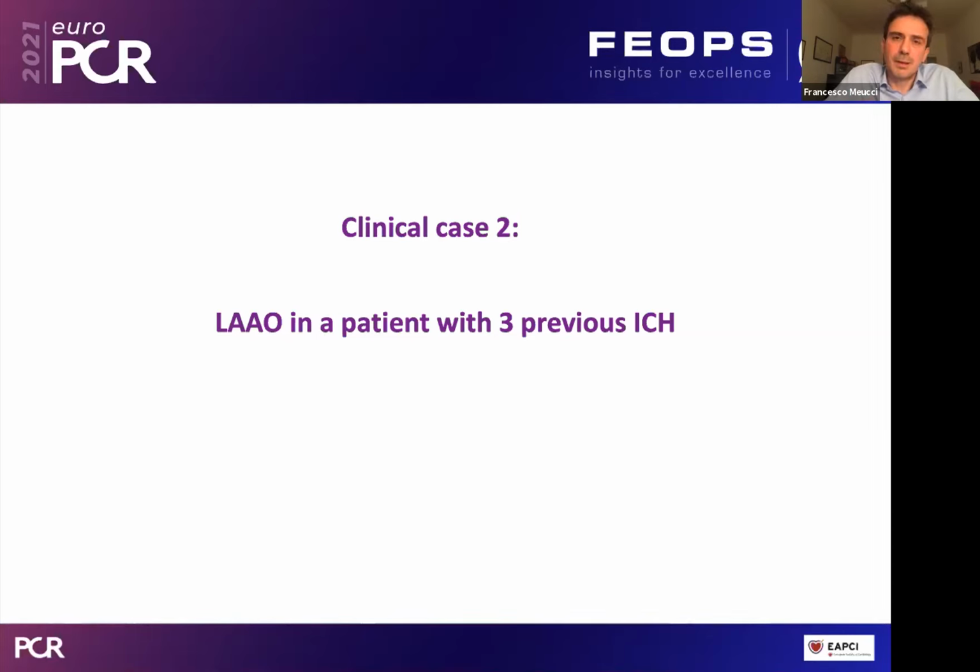It is a more relaxed choice, and I think the prediction is real in the sense that you are very well oriented once you go there, and you change your mind if you see significant difference, let's say with the echo measures, but you still can rely on, as I showed you in this case, what you have measured on the CT scan.